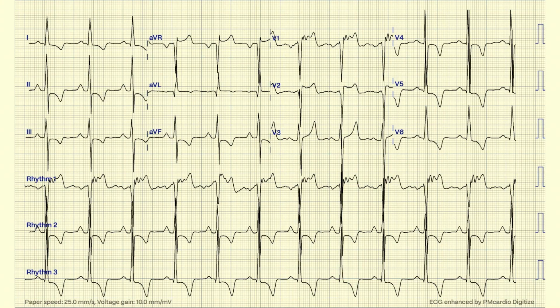And then just one more, just to kind of make the point. I just want to show you that it can look a lot of different ways. It can distort the ECG. And if you call me and I'm like, nah, that's just LVH, you know that I'm not making it up. It just really does make the ECG look weird and ugly.